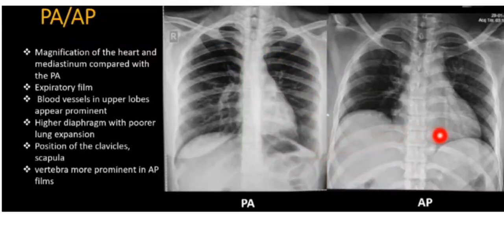The other difference you might see is the scapula. In the AP X-ray you can see the shadow of the scapula, and you can still visualize it inside the lung fields. But in the PA X-ray, the scapula shadow is away from the lung fields. It's not like this one here, where you can see too much scapula shadow inside the lung fields. Here you can see only a little bit, in the more peripheral regions. So that's the difference.